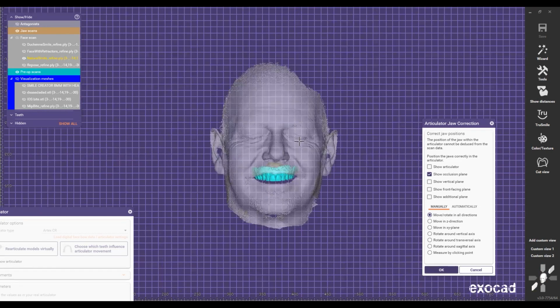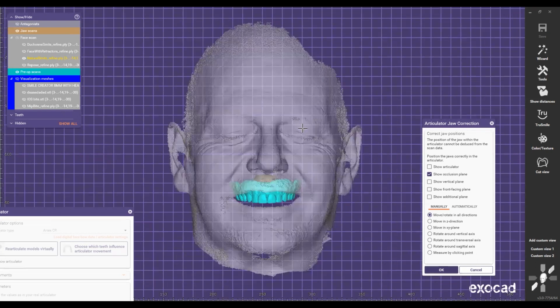So what we do is, even if we have the eyes open, we're not going to be able to see the pupils of the eyes, because it's going to get distorted, it's watery there, right? So the scanner won't be able to pick it up. Even if I try to scan the eye with an intraoral scanner, it's not going to scan that. So what we do is have the patient close the eyes, and we use the inner canthus of the patient's eyes, and that's how we put it straight. We use the background lines, and we straighten that face accordingly.